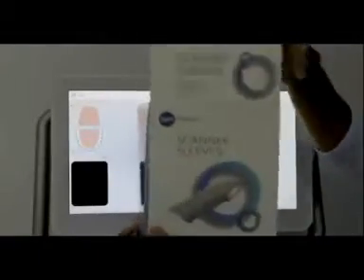Okay, so initial record, and then we follow the flow chart on the top of the screen. That is the scanner head, and let's put a scan sleeve in there. These are one-use scanner sleeves.